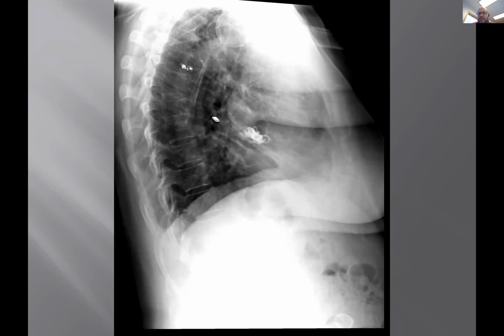Anybody else? Maybe some calcification in the gallbladder or something on that lower corner. Yes, very good. Very good. Right here, there's a circular calcification right at the edge of collimation within the soft tissues. Yeah. And I like this case because it teaches us to look at all 4 corners of the films and to make sure that we don't just make a finding under the bone and then get satisfied and let it go. And this is anterior to the spine.